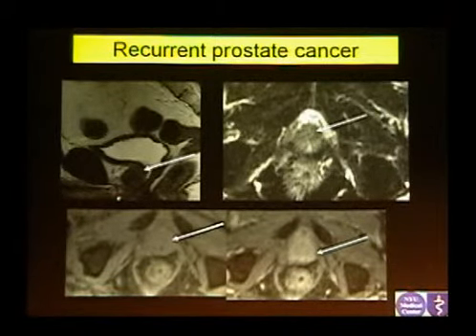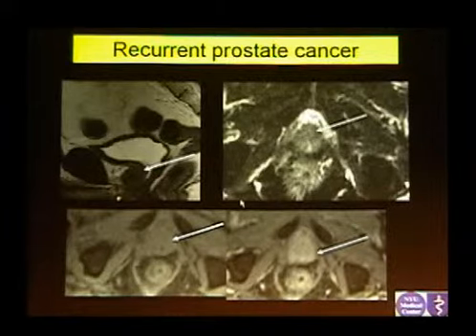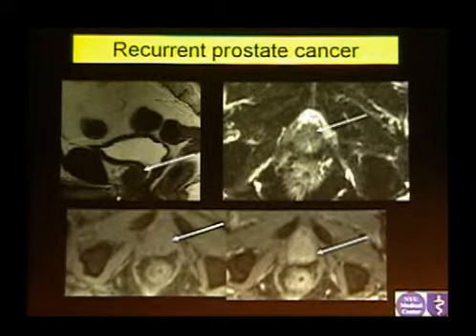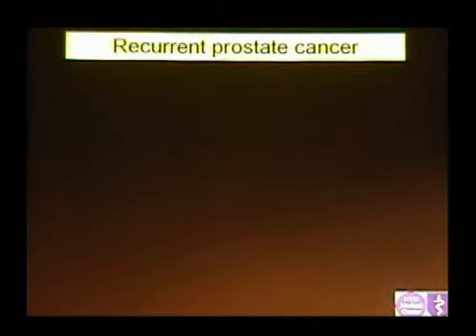This patient, I think it was months after. I thought about 6 months or something like that. So this is abnormal anyway. If you image very early, you can see hematoma and all those changes, but this is clearly not blood. It's basically prostate tumor recurrence. The patient can be treated with radiation therapy after that.